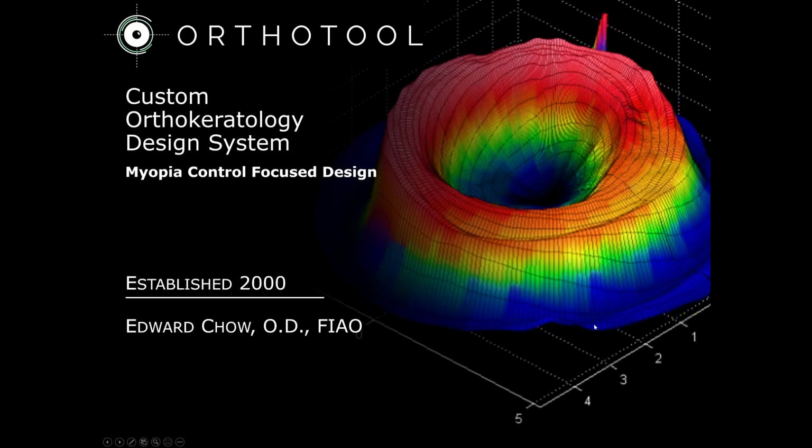Welcome to the Orthotool Orthokeratology Custom Design Lens System. In this section of the certification, you will learn to use the unique design methodology behind Orthotool custom lenses and begin optimizing your orthokeratology treatment for success.